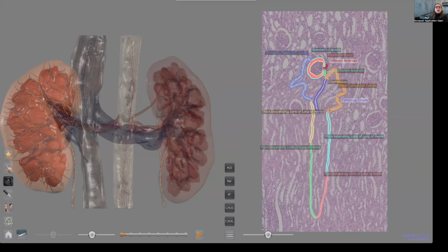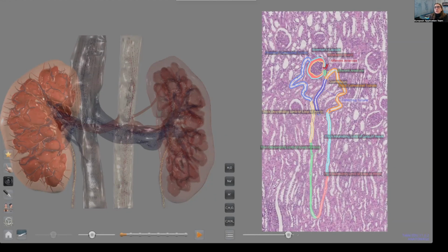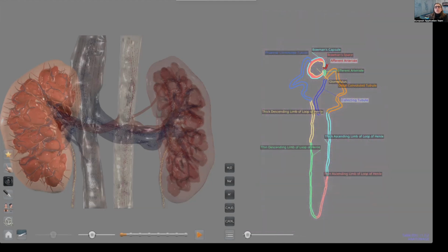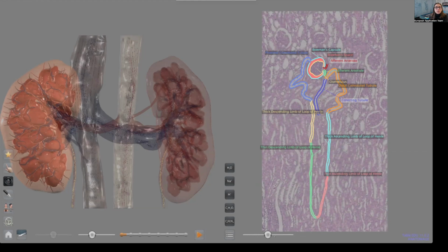Once I have activated some of the annotations and some of the segmentation, I can then act on the level of brightness of this scan. So I can increase the brightness a bit to have the details of this scan clearer, or I can also reduce it to have only the scheme of the segmented part visible.